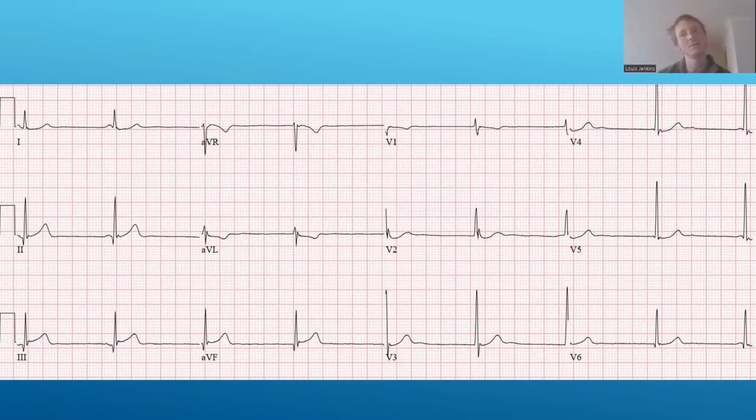And I think that looking at the forest thing, it's a gestalt thing. If you see 1,000 normal ECGs, which, if you have some experience in doing this sort of thing, most of you probably have seen thousands upon thousands of ECGs at this point in your career, you do just get the vibe of the ECG sometimes. You look at it and you're like, yeah, the vibe's off. That's how I feel about this one, and I'm sure it's how a lot of you feel.